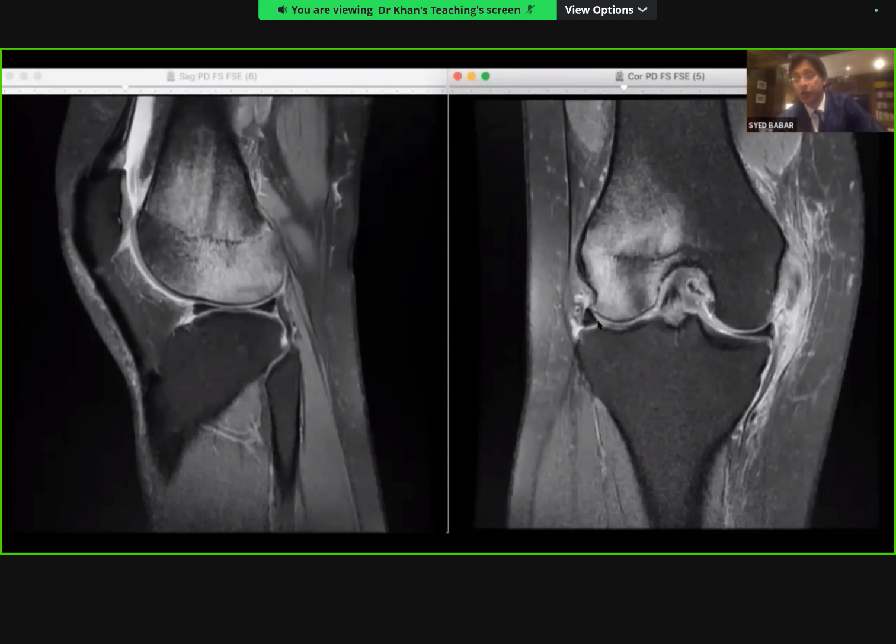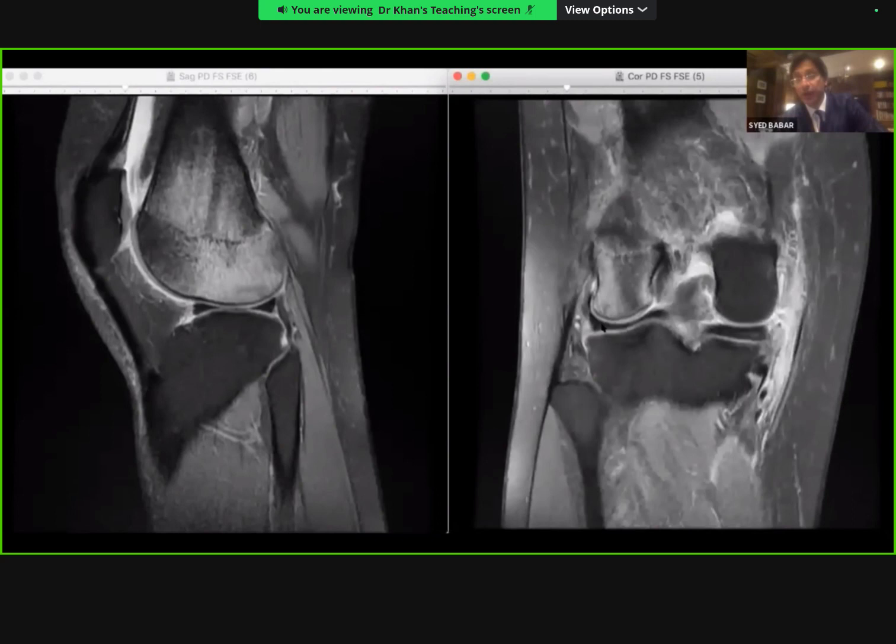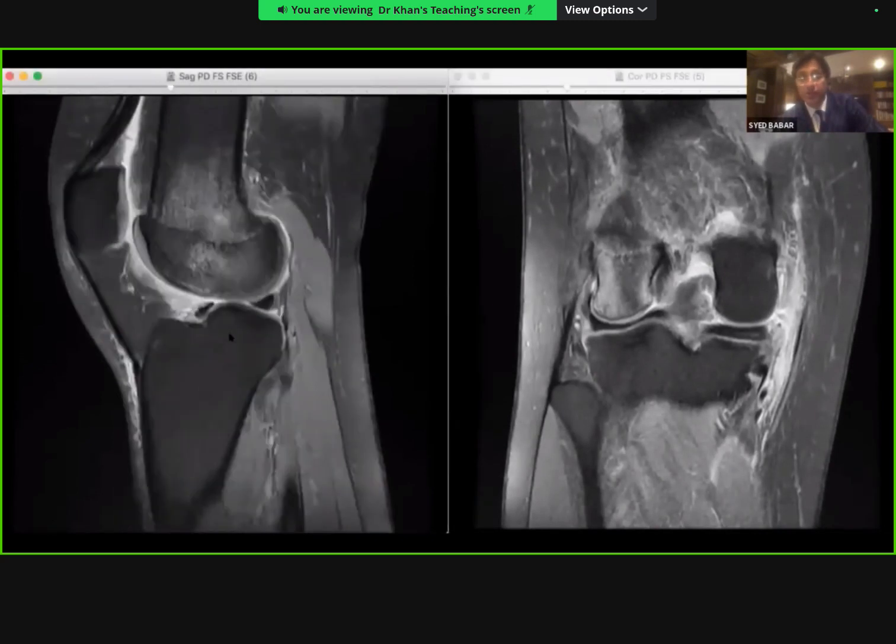If you're not absolutely committed, you just say there's blunting of the inner free margin of the body of the lateral meniscus, which may suggest that there is a small radial tear of the inner free margin. So I would definitely make a comment, even if it's negative or positive, tell the examiner that you've seen this. You keep going back and the posterior horn looks beautiful, so there's nothing there. So we picked up two things. Let's keep going towards the center.